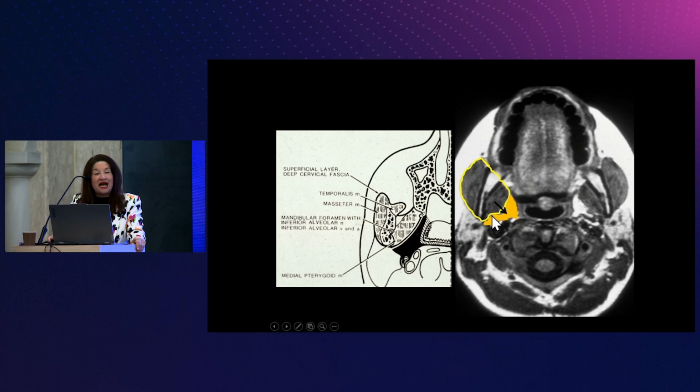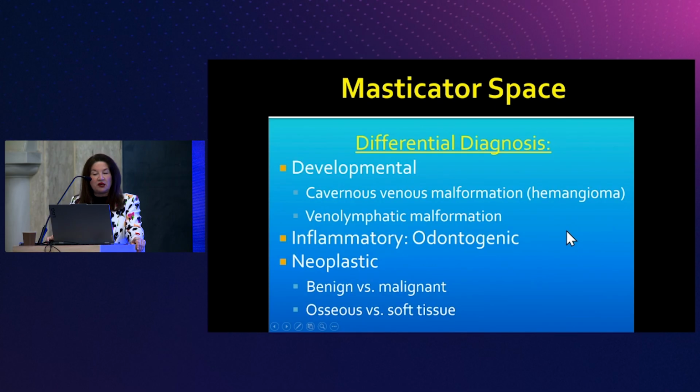Here is our prestyloid parapharyngeal space. When lesions are large enough here, and when they occur medial to the mandible, they're going to displace the prestyloid parapharyngeal fat posteriorly and medially. So that's one of the things that you want to look for.